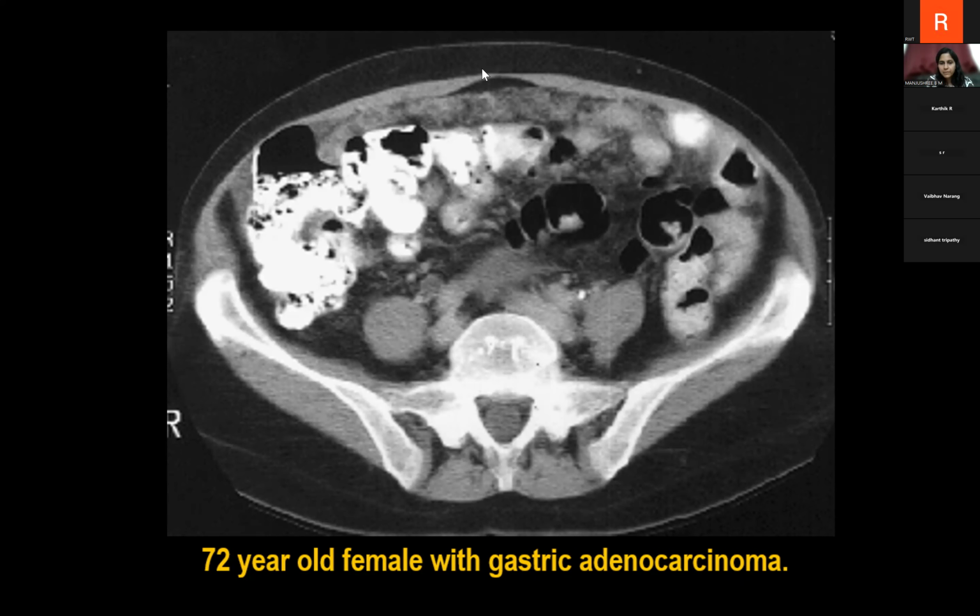Okay, time is up. Yes, many of you have answered it correctly. It is omental caking. Priyam Sharma has answered first. This is omental caking. Very good.